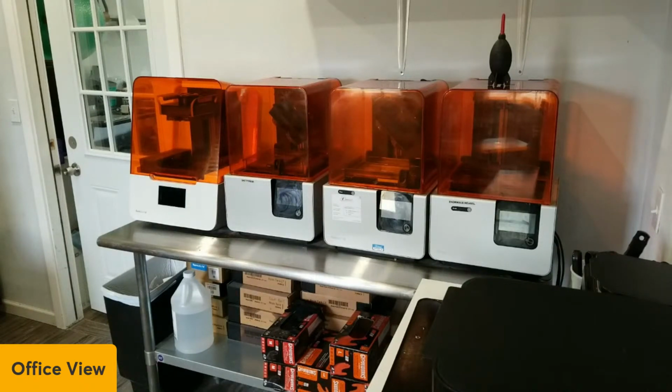I can't make 36 retainers a day. I can do about 16 or 18 on a pretty easy day. I could probably do 36 if I just bust it and have help 24/7. But I can probably do about 16 retainers a day by myself. And so it prints 18. That's enough for me for a day. So I can print double that in a day. So good question.